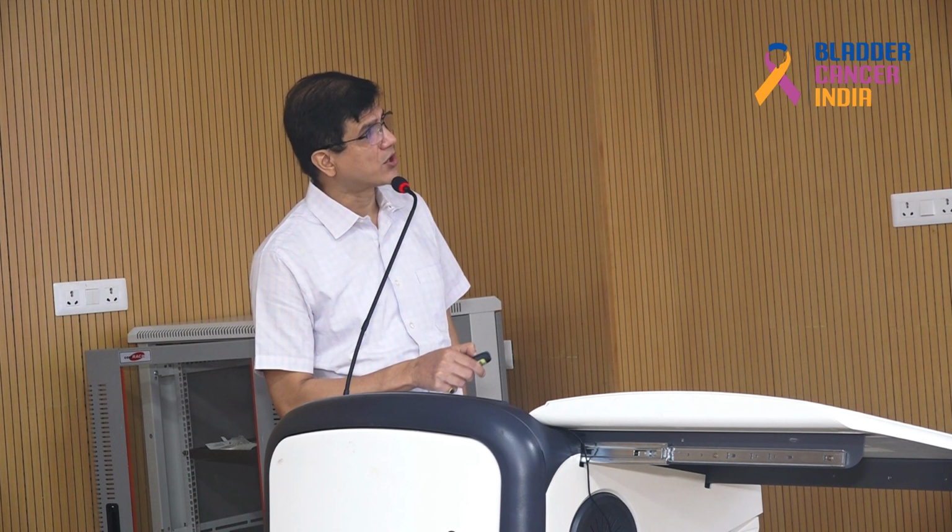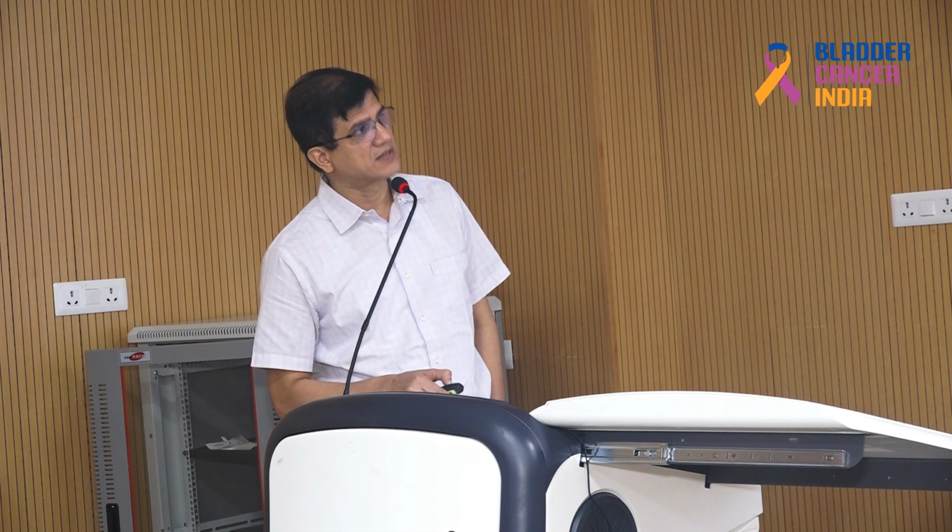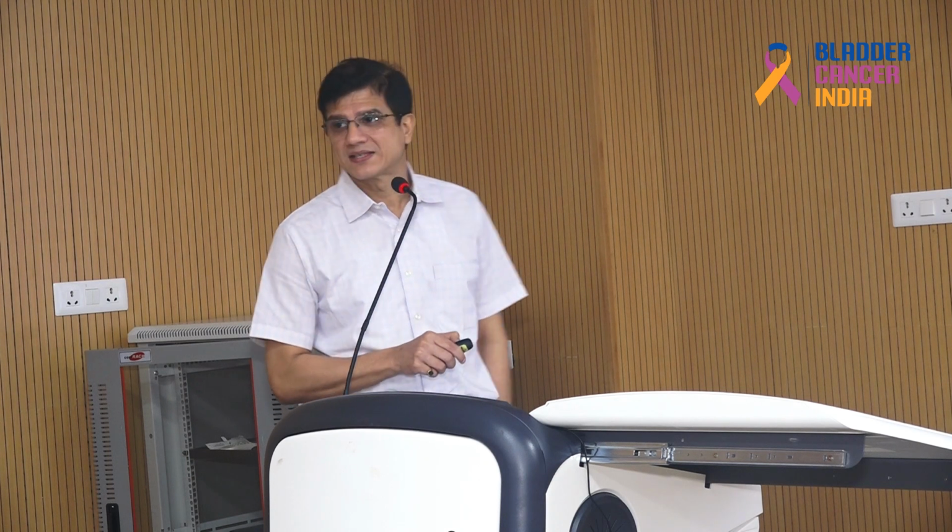image, mass lesion, intact mucosa, stalk. This is hypo, on contrast it enhances. On diffusion weighted, it is hyper, and on ADC, it is low. This is a malignant mass, and VI-RADS, this is either 2 or less than 2. Depending on the size of the tumor, less than 1 centimeter, more than 1 centimeter, it can be VI-RADS 1, VI-RADS 2. But either way, it is 2 or less than 2.